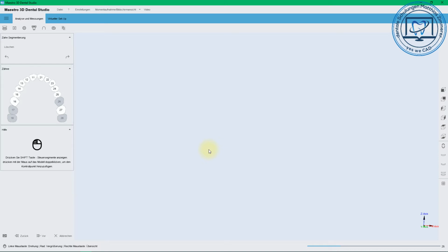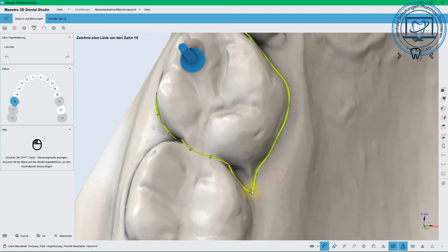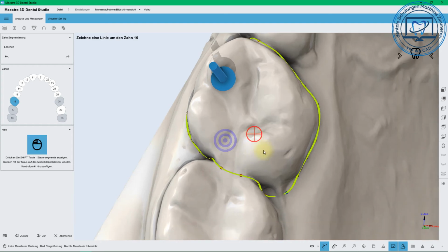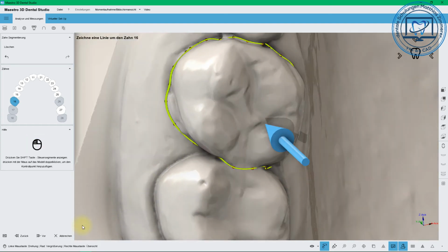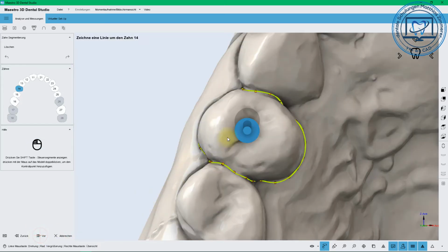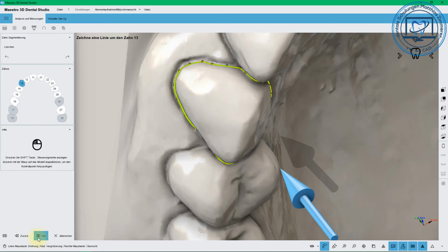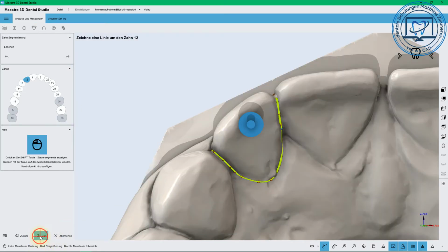Most of the time I would also recommend, if the plan is just to move the upper jaw, to also segment the lower jaw with it. For the first time it takes a little bit longer, but if you have to make some changes in the lower jaw at the end, you don't have to make the segmentation or the tooth setup again, and can just work on it.